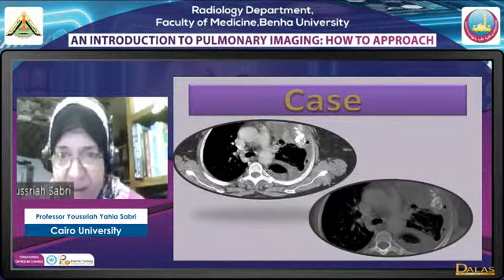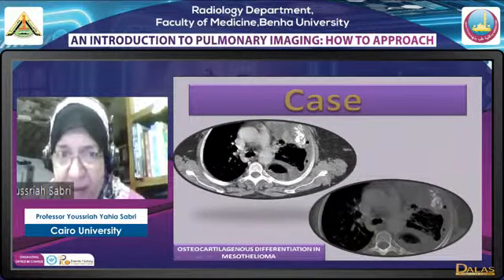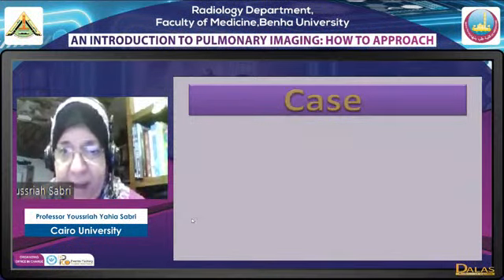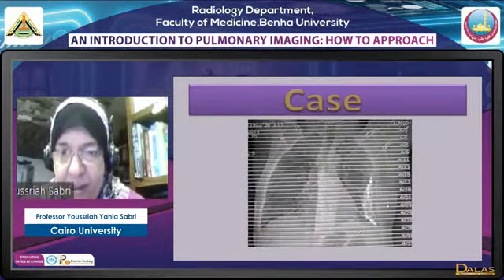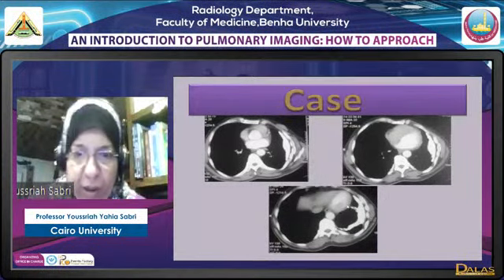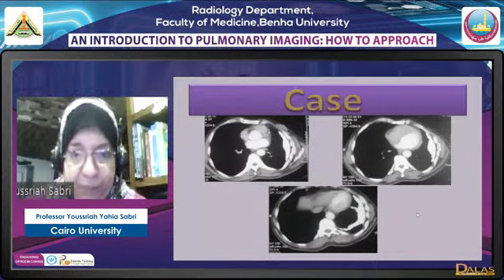This globular calcification is a lesion by itself in the mesothelioma, and it's called osteocartilaginous differentiation. And it could be very massive, as in this case. In this case, the whole mesothelioma has shown this pattern of osteocartilaginous differentiation, and even the fissure is affected.